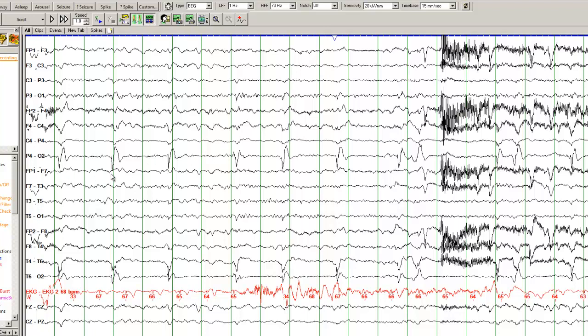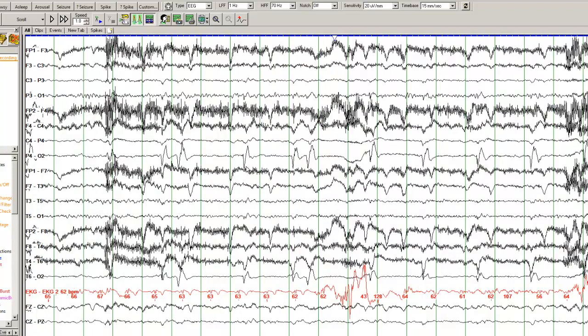These sharp wave discharges that you see occurring almost every 2 seconds, sort of in a periodic manner, are called PLEDs, which stands for periodic lateralized epileptiform discharges. So there is an asymmetry between the left side and the right side. Both hemispheres are slowing. The right hemisphere also shows these PLEDs. Now let's move on with this EEG. You can see some muscle artifact that is there.